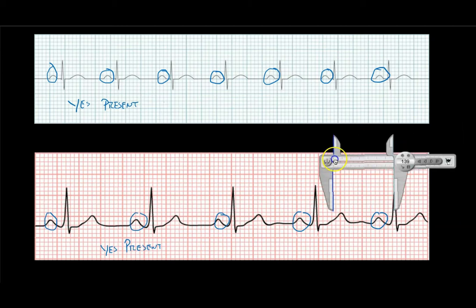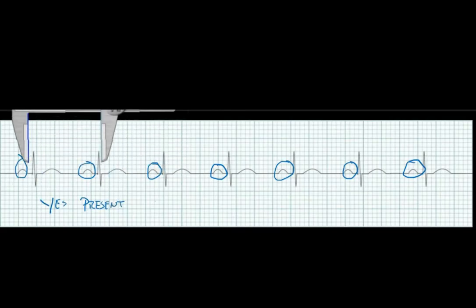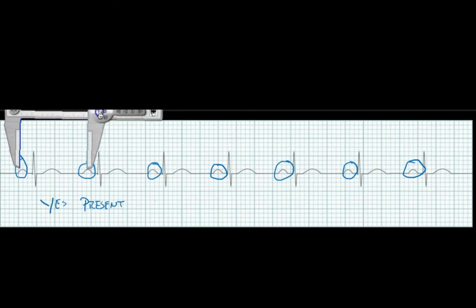So I'll pull those back in here. And it doesn't really matter which way you use this, whether or not you use the ones on the top or the ones on the bottom. And everybody always wants to know, should we go to a particular part of the P wave? I like to go at the top. So if I go from the top here, I want to go to the top here. Okay, so I want to make sure that I'm measuring it in the same spot each time.